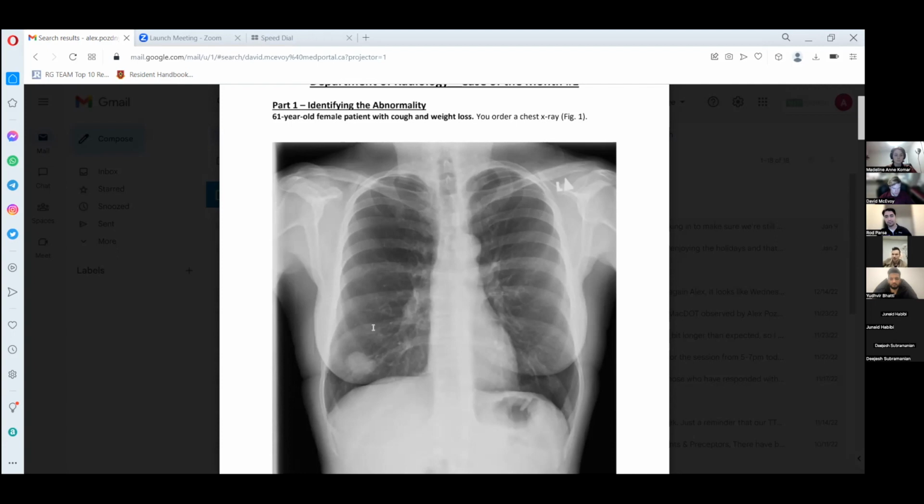So yeah, fat will usually be less dense. Fat is going to float, and that's why it will appear a bit darker than the blood or the fluid. So that's another useful way to tell apart different fluids in your CT examination. It applies less to radiographs, but in CTs you can tell very well whether you have fluid or it's actually fat, which usually is a bit darker.